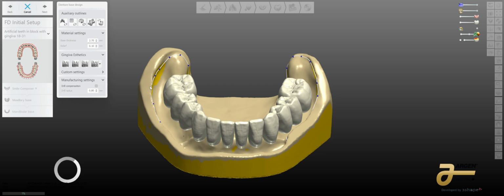And let's go ahead and preview this real quick as well. And you're going to see it doesn't take a tremendous amount of time to be able to do something that is going to function quite well. But it's really predicated on the fact that you are going to get good digital information from your clients.